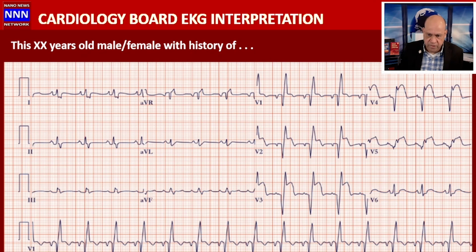Okay, here what do we have? We have a sinus rhythm here, low QRS voltage in the limb leads, and we have left atrial enlargement or abnormality. We have right bundle branch block. We have QS complexes V1 to V4, suggestive of anteroseptal myocardial infarction. We have acute ST-T changes suggestive of myocardial injury. That's the one we need to circle. ST-T changes related to myocardial injury.